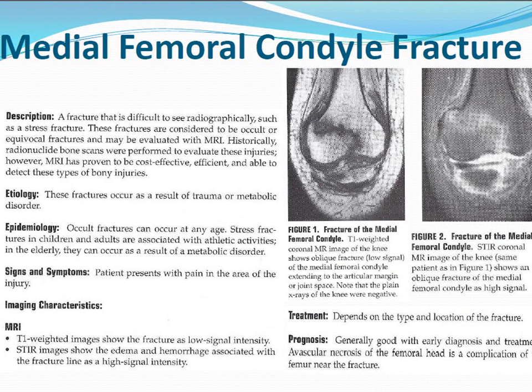Sometimes you'll just know the patient has a lot more pain than you're expecting for someone who doesn't have a fracture. Sometimes on an X-ray, you'll see the patient has a large joint effusion, a reactive joint effusion, and you'll start to think maybe we should do an MRI of this. It's similar to the impaction fracture, where you just see this low T1 weighted signal intensity line, T2 bright signal intensity line. This is actually where the fracture has occurred, and you may see a little bit of reactive fluid. You may see fracture in the medial tibial plateau.